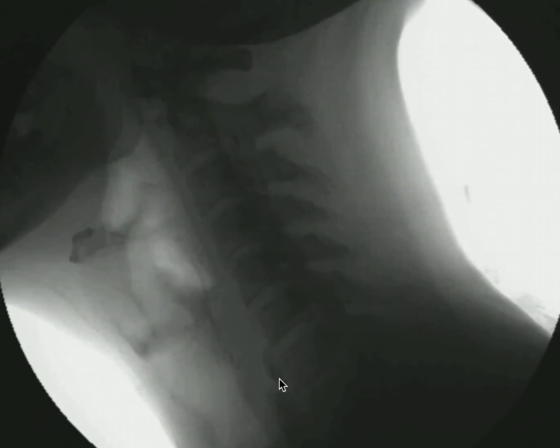Now, a Zenker diverticulum can be quite large, and it tends to be larger than the smaller Killian-Jamieson diverticulum, which usually tend to stay less than 1.5 centimeters in size. These Killian-Jamieson diverticula are going to be inferior to the cricopharyngeus muscle.